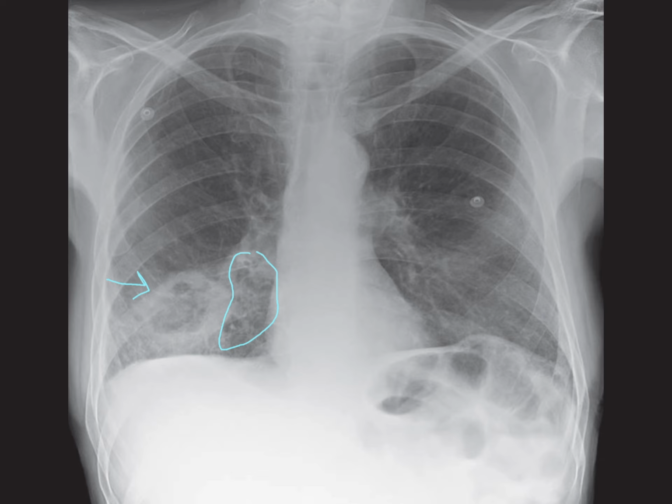Primary cavitating lung cancers, especially squamous cell carcinoma, generally have a worse prognosis when cavitation is present. However, it's worth noting that the presence of cavitation typically rules out small cell carcinoma as a diagnosis, as small cell lung cancer rarely cavitates. So in summary, this case is a complex and critical one, highlighting the importance of a thorough and methodical approach in radiology. Whether you are a radiologist or a student, understanding these nuances can significantly impact patient outcomes.